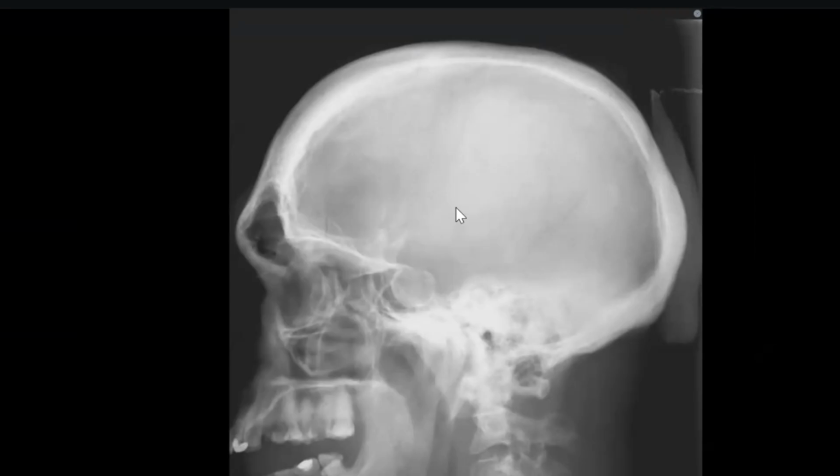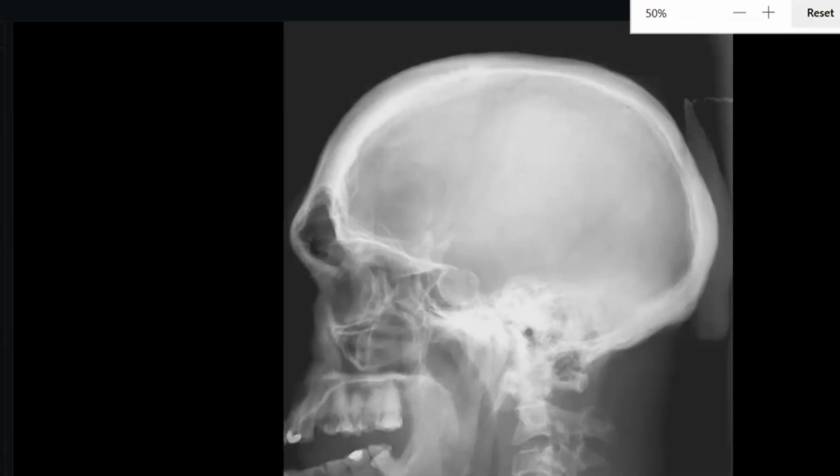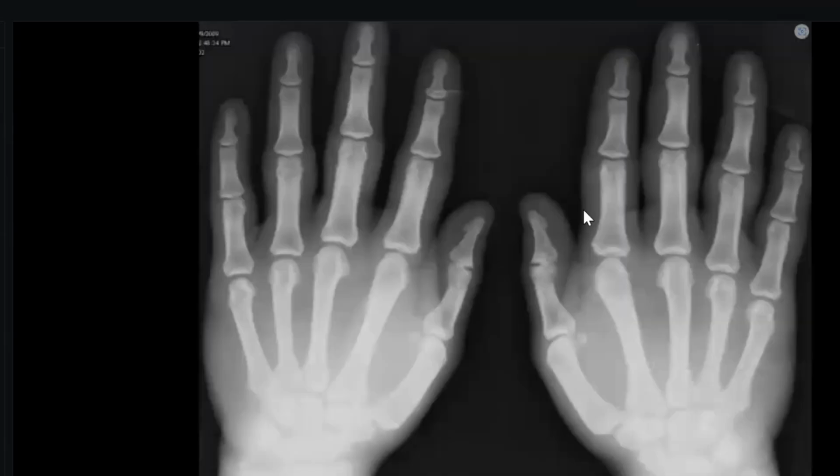Then, sir, acromegaly would be my diagnosis because of the thickened calvarium, and the pituitary fossa appears to be raised. Also, there's hyperinflation of the frontal as well as maxillary sinuses, and the whole calvarium appears thickened with frontal bossing. Acromegaly.